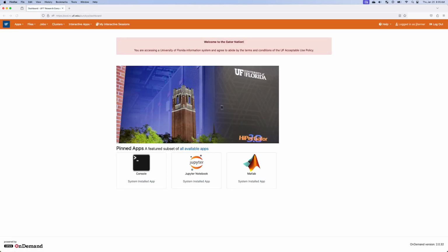ood.rc.ufl.edu, and I had already logged in, but you would need to log on. If it's the first time doing this on a browser, you would need to select your university, in this case University of Florida, and log on with your GatorLink ID and password. And so we see this, and I'm going to show where the data are.